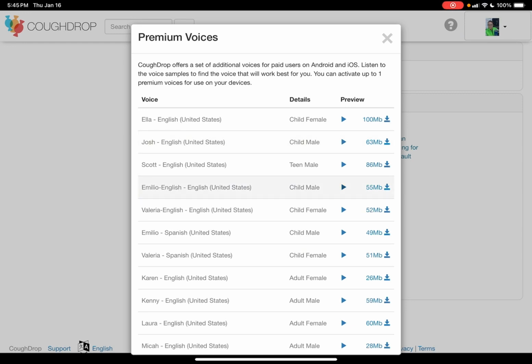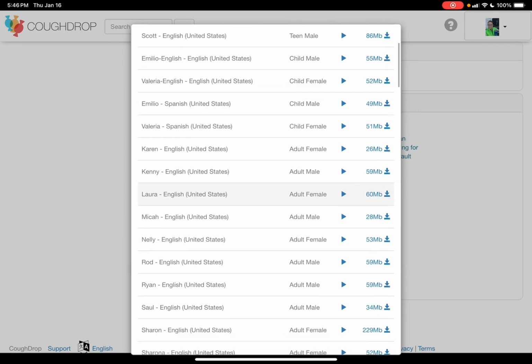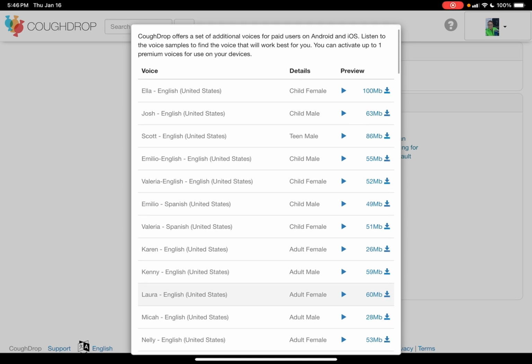I've shown you some of these voices on other programs, like on TouchChat and ProLoquo2Go. So here we have these premium voices that we can put on. So let's do, I don't really want Ella, Valeria. Let me see. Do you like my voice? This is how I sound. Yeah, I do like your voice, so I'm going to choose you. That's Valeria English. Then you have Valeria.